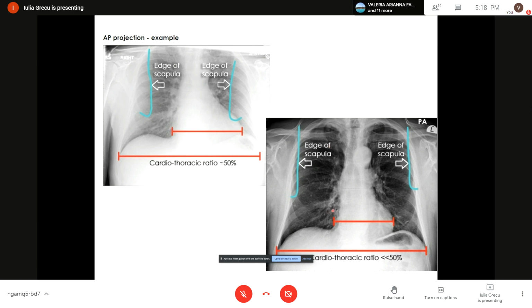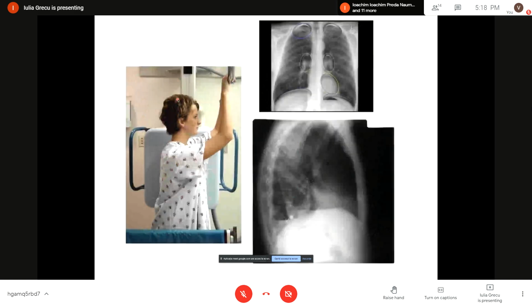And the same patient in posterior anterior view, with a clear view of the lungs, with a normal shaped and dimensioned heart, with clear view of the lung parenchyma, with the vessels with a proper distribution. Here you can observe, if he lies on his back, the vessels tend to enlarge at the upper part of the lung, which is an effect of gravity.